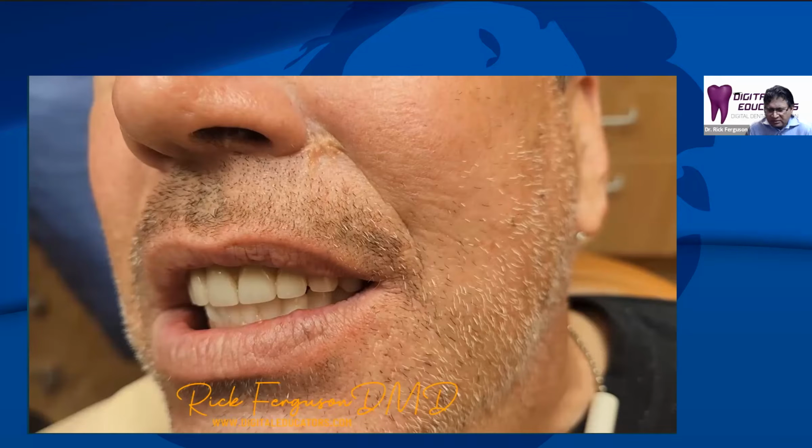And if you follow the design parameters and make it thick enough, it's going to last the 5 months. And then, it's really rigidly fixating those implants together. So we're having a lot of success with this technique.